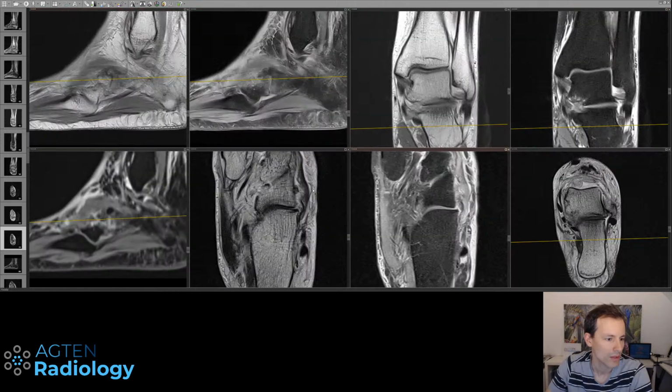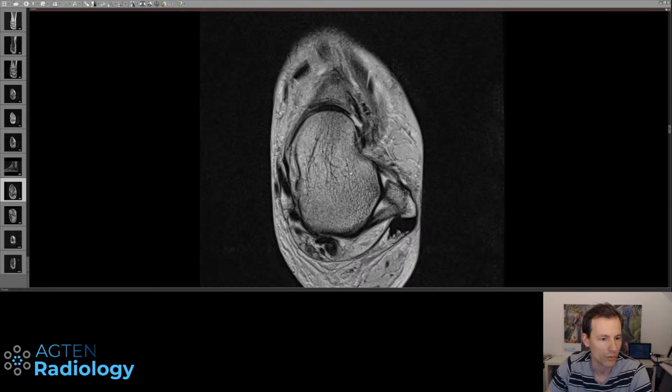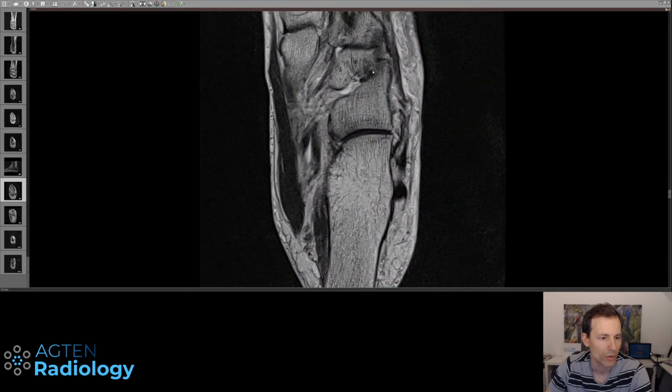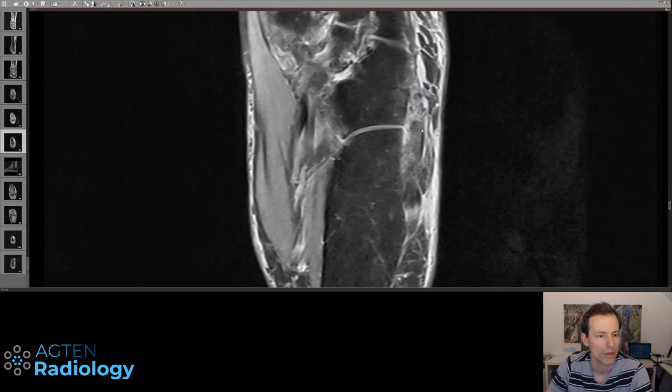We can see this probably better here on this T2 transverse section. So going up here, it's the ankle joint. We scroll down: talar head, navicular bone, calcaneus, cuboid, and you can then nicely see the joint capsule here. Probably part of it still here, and then it's somewhere disrupted at this level. And all in between here, this is joint effusion, as we can see nicely.